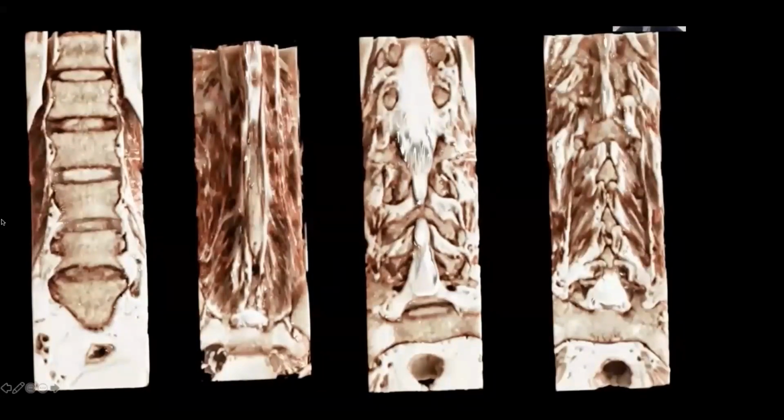Again, this is probably a bit different to the coronal sections you're used to looking at, but we have a good sense of what the vertebra and the intervertebral disc spaces look like, some idea of the degenerative process. And I think this really captures that better than traditional MR. Here, coronal section through the musculature with the erector spinae depicted here. And you can really see the fascicular nature of the musculature.